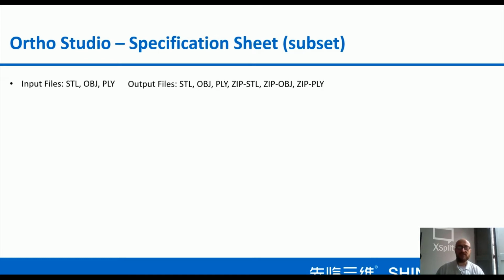It means that the system is open, so you can import surfaces acquired by every kind of scanner and you can export the output files for producing them to every kind of production machine. It's possible to record a video during your design. This video can be added to the final report.